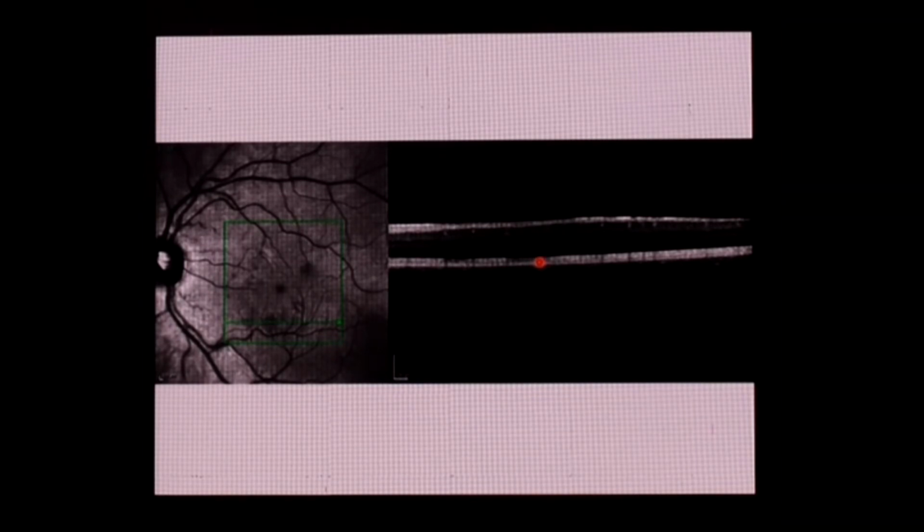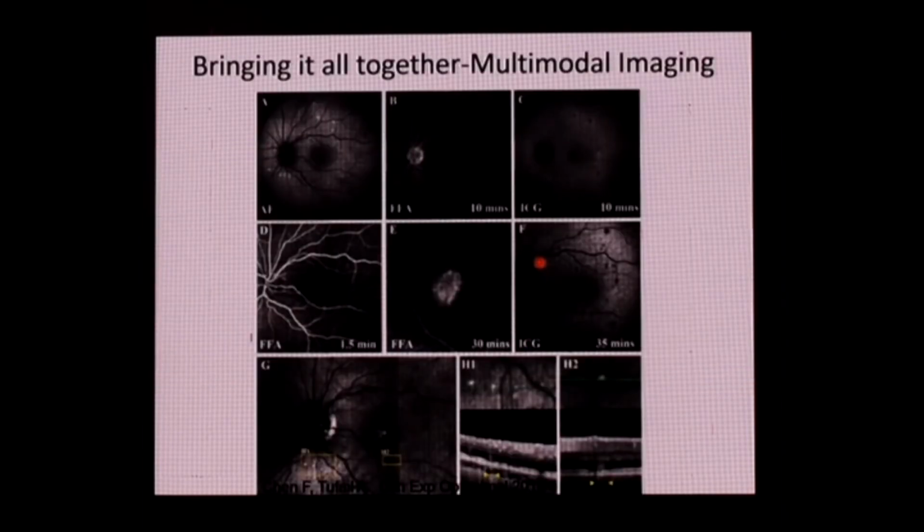So this, to me, is a separate disorder from the middle retina ischemia, and on follow-up there was no thinning of the middle retina. So this, to me, is acute macular neuroretinopathy, and there is an overlap of symptoms with some of the middle ischemic retinopathies as well.